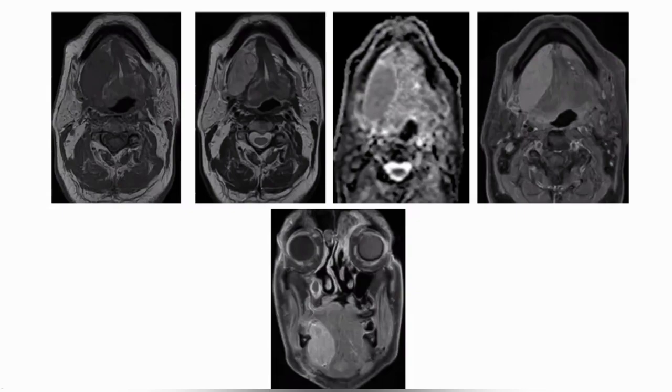You concluded that this is a tumor rather than infection, so that is very nice of you. And you described that this is in the floor of mouth, and it is showing diffuse contrast enhancement. So it's not a cyst, because contrast enhanced sequence helps you to decide whether you are dealing with a tumor like a mass or you're dealing with a cyst. Because there are many cysts that can happen in the floor of mouth, for example, ranulas, epidermoid cysts, dermoid cysts, or thyroglossal duct cyst. So you rule out all the cysts by saying that this is demonstrating diffuse contrast enhancement. And also on the ADC map, you're seeing that this is showing diffusion restriction. So it's basically a highly cellular tumor.